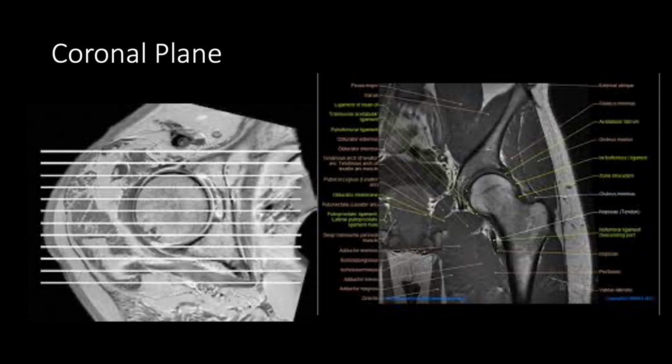And here you see the femoral head, neck, part of the femur. You see the muscle contributions here. So I'll let you kind of look at those, but there's a ton of detail here on what's going on with these muscles and function here. So kind of get an idea of what you'd be looking at in regards to anatomy with this cut.